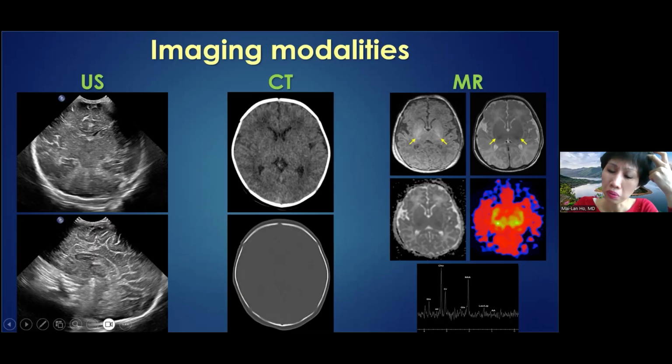So that's important too. And then MR spectroscopy, another advanced tool, right? So we can do voxels. Usually they'll do one over the basal ganglia, like a single voxel, and one over the white matter. And then you can basically get the different metabolites. This here is a long echo MRS. And so we're just cleaning up the baseline here, essentially just looking at the major metabolites.